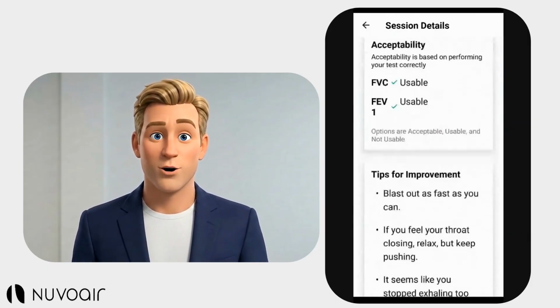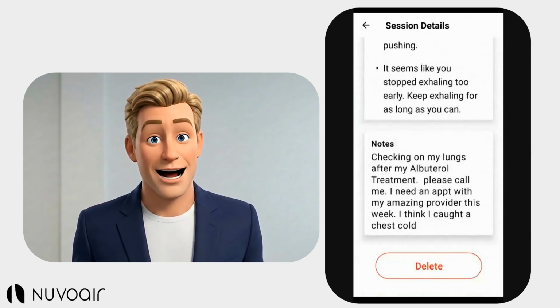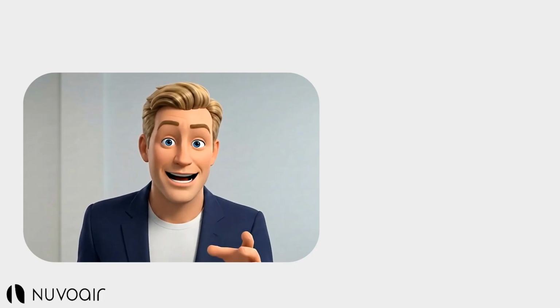Please do me one favor. Never delete the tests. Even if you mess up, it's okay. The team that reviews them has a keen eye and can remove any hiccups that happen.